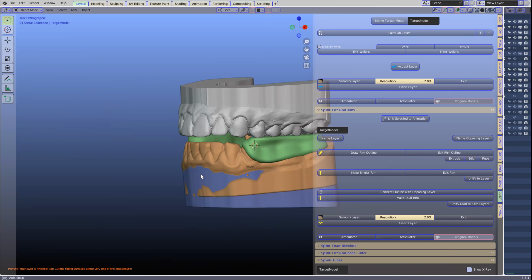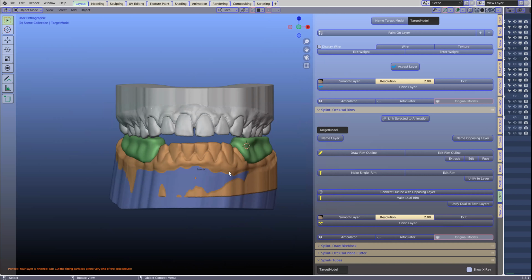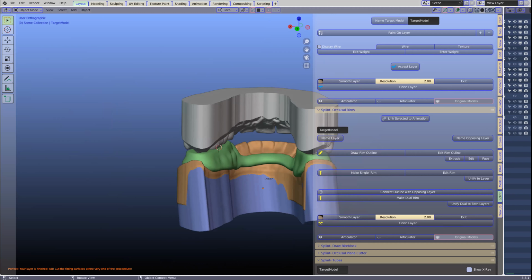Okay. Sorry, if you look at the pictures I sent you, on the lingual portion, there's a wall. Can you show me how to add specifically to the lingual side? Just see your picture. Just have to grab that.